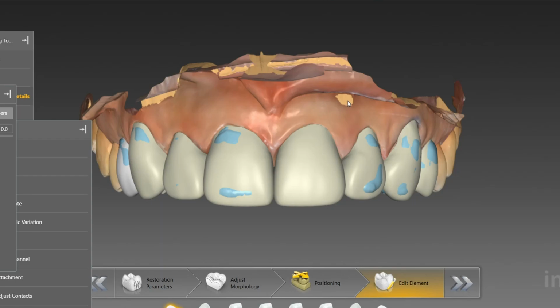And well, I mean, the software does it. It's just you're getting less than good results, to put it nicely. The interproximal contacts usually run into major issues. Just the way that the interproximal contacts are calculated is quite funky. And then your contour lines are usually compromised. And if a wax up is scanned improperly and you're missing areas of data, typically those areas will fill themselves in. And then when you try and copy that area, the contours just aren't there.